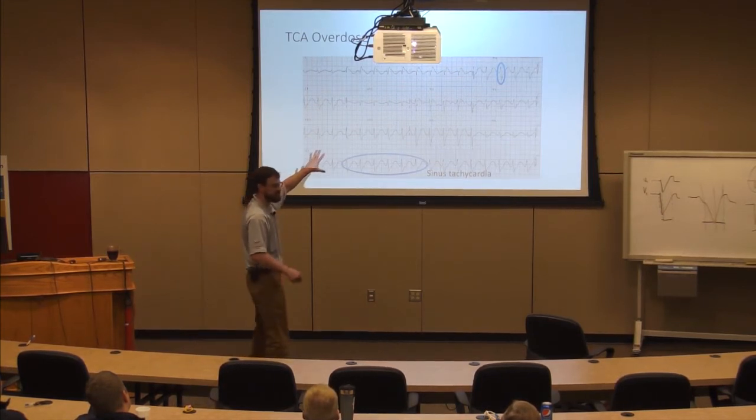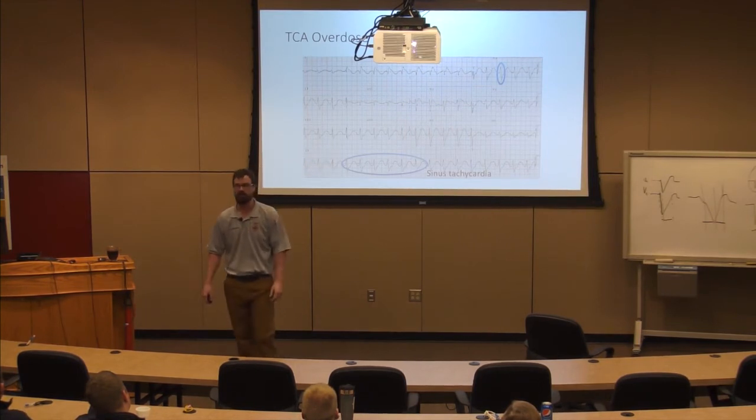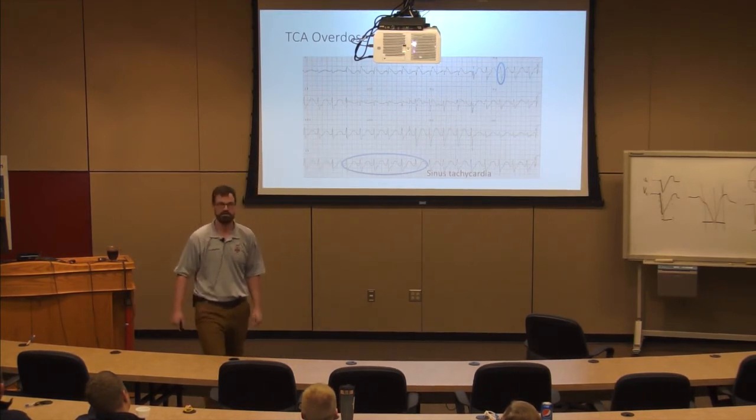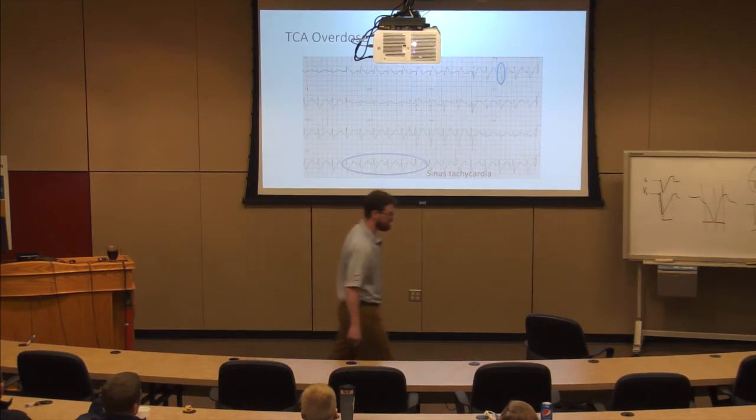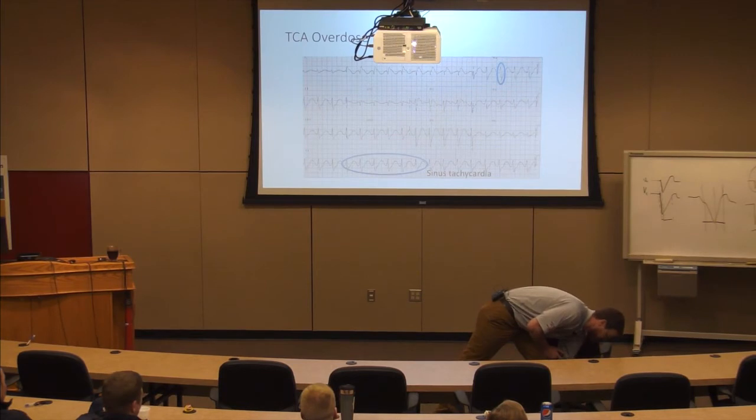Wide and bizarre is my first thing. What's my supporting variable or my supporting finding? What clinches that diagnosis? I'll give you a hint. What are you chewing on? I'll give you a hint. It's a lead that we never pay any attention to.